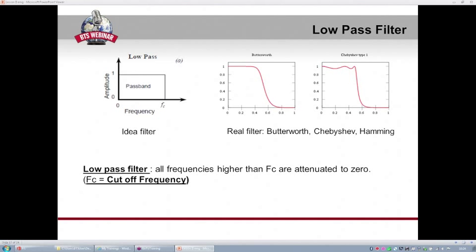So you will find in our application different options you can choose between. They are very similar, but they differ just in the shape and in the degree of the slope, as you can see from this image.